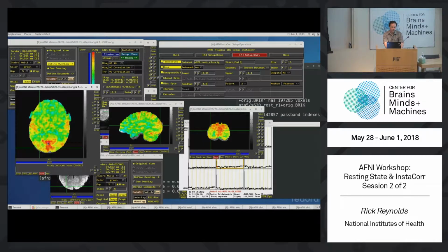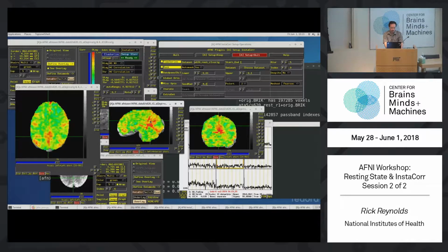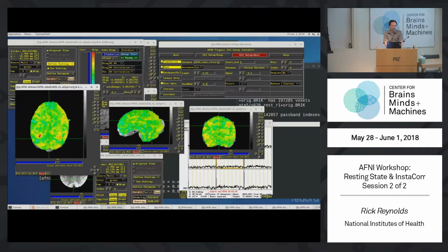Drag in here, we perhaps, I don't know if we're getting into that default mode network here. I'm not going to worry too much about what networks you need to find here, but just browsing your data and seeing how networks change over space is very, very interesting.